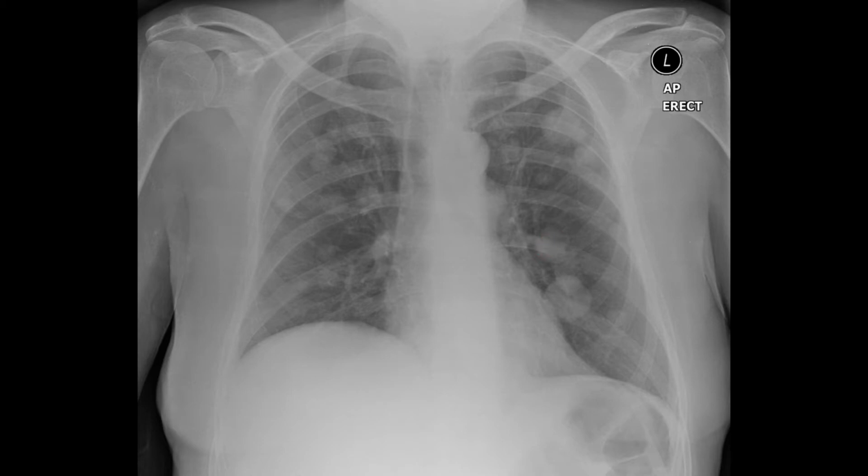Note that I use the word projected because at this point I'm not entirely sure that they are definitely within the lung, and it leaves an option open for me to consider the anatomical position being in the lung, the skin or the bone. These are actually cannonball pulmonary lesions. They overlie the bone, they overlie the skin and they overlie the lung.